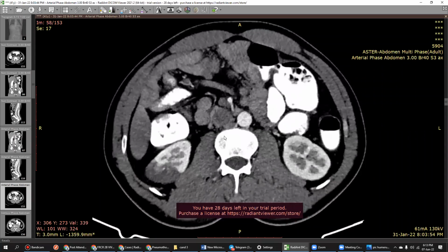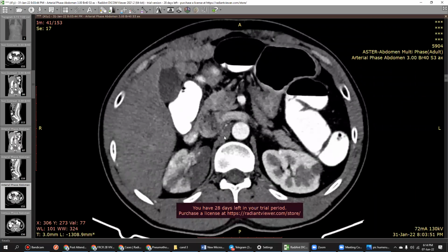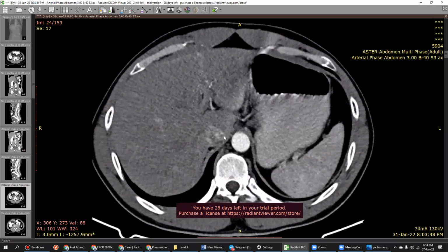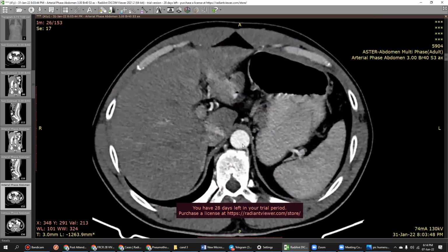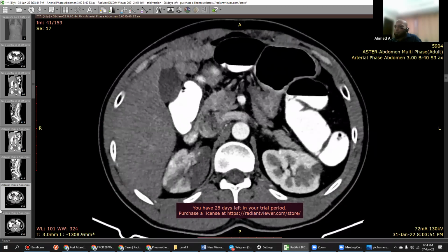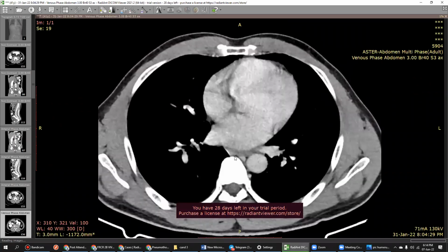Sorry, it is still jumping. I'm waiting for you to conclude the case. So in conclusion, depending on the arterial phase of this study, you can see the aorta is enhancing very nicely, right? This is arterial phase. So you want the venous phase, for suspected venous infarct? Yeah. Okay, just a second.